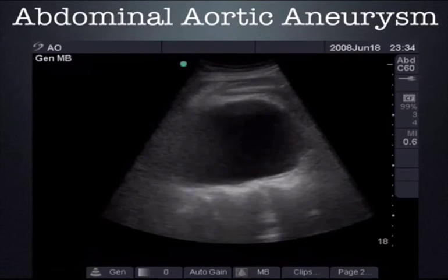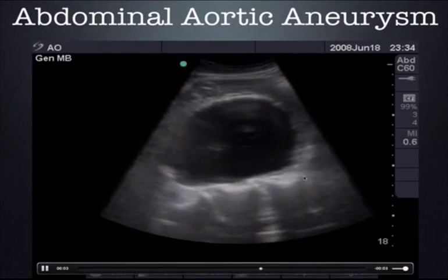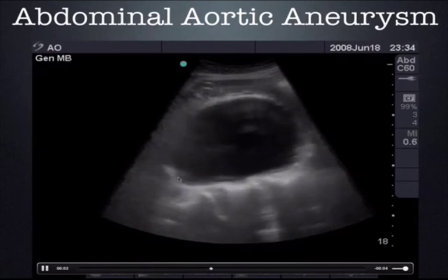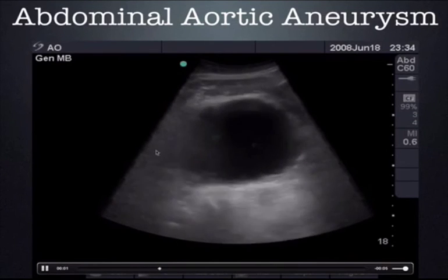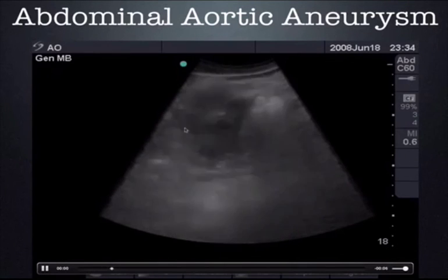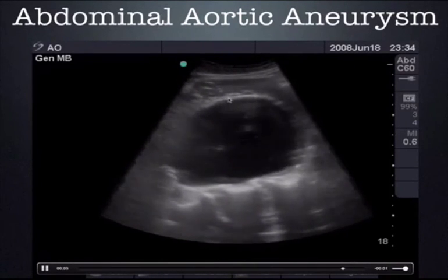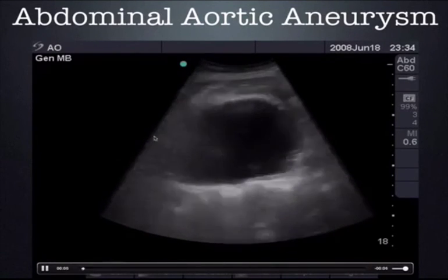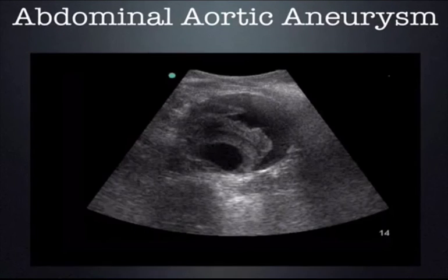Now this is the same abdominal aortic aneurysm. They've turned the long axis here, and you can see the spine here. And here is the aortic aneurysm, a nice fusiform aneurysm, and you can see that it tapers on either side, and the normal segments of the aorta are hidden in the bowel gas. So again, this illustrates quite nicely that the most anterior portion of the aortic aneurysm is only 2 to 3 centimeters of depth and is quite visible despite the fact there is a lot of bowel gas around this aortic aneurysm. Here's another image.